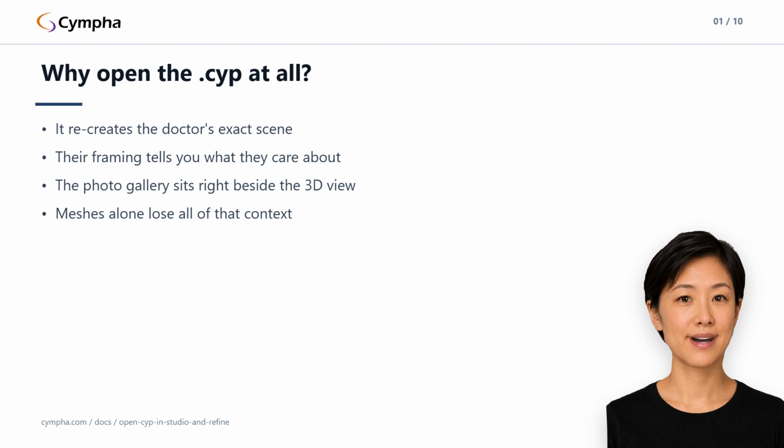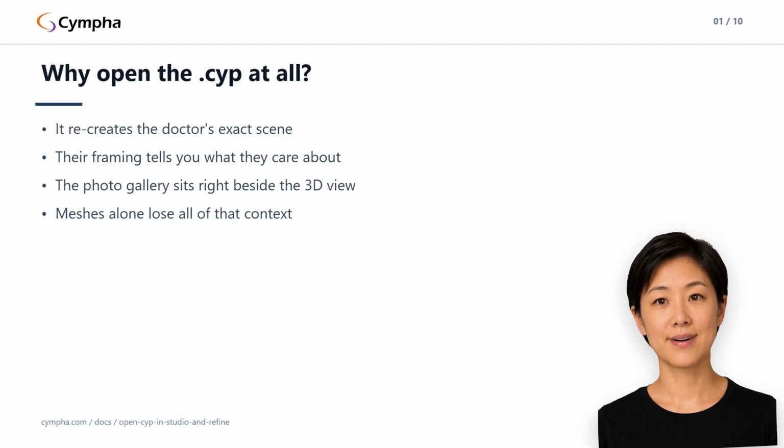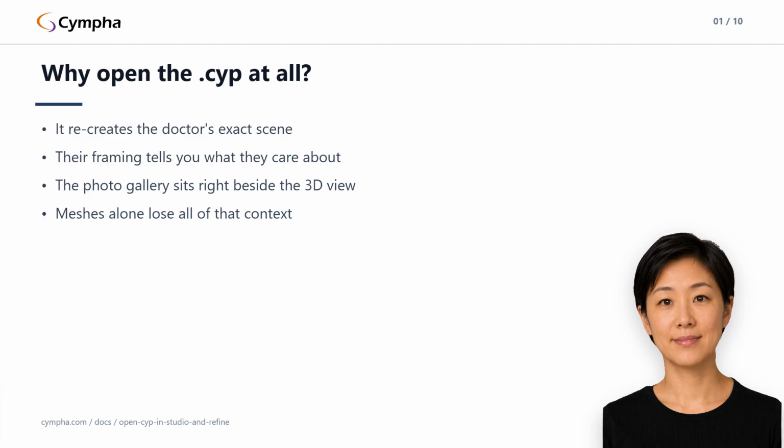For prerequisites: a Cympha account in the designer role, or a lab manager standing in for one, and actually approved. While you're still pending, your assignment's queue stays empty, and the designer's first day lecture covers that. The Cympha agent manager installed and showing paired in the tray. The install and pair guide walks it if you haven't.